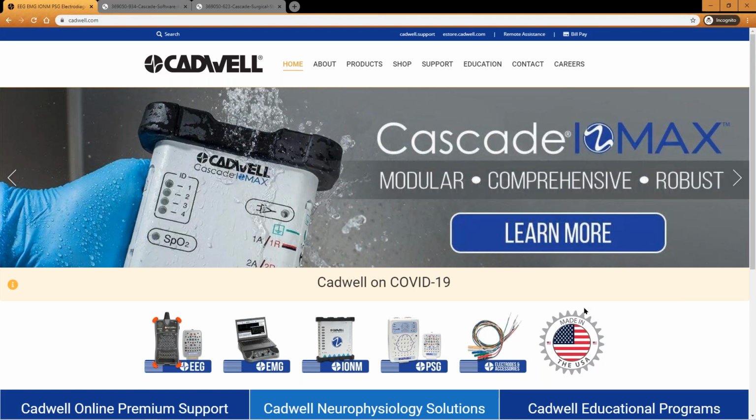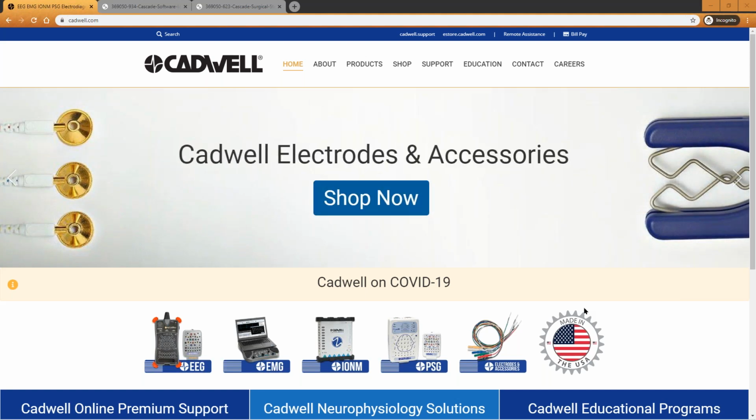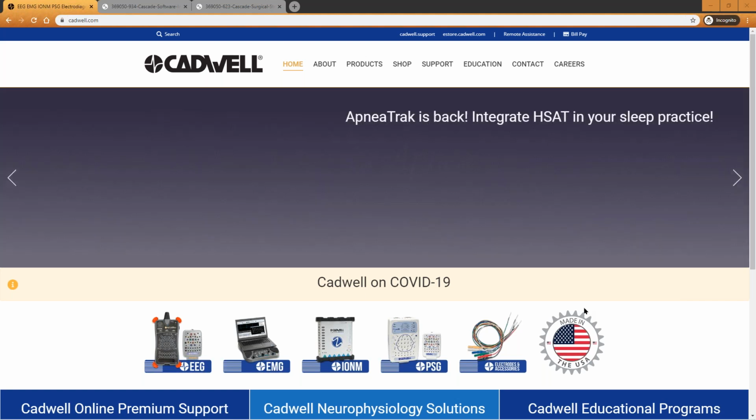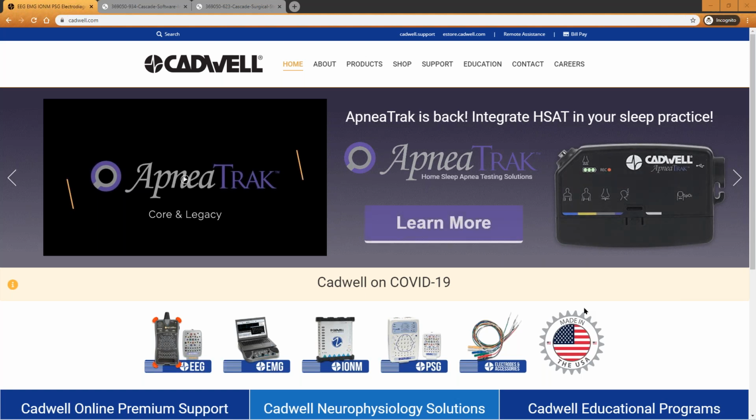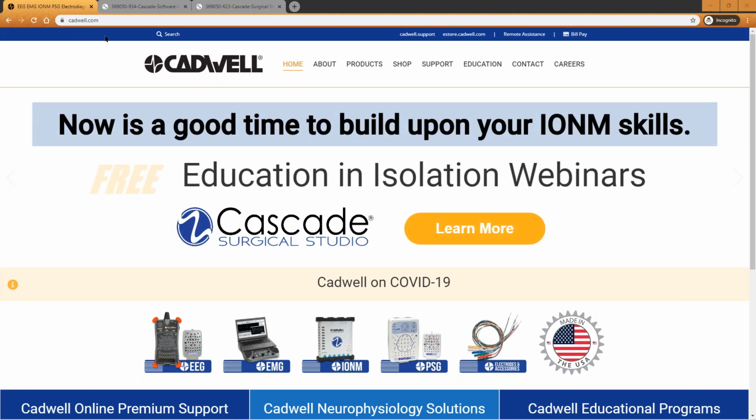Now, to get your hands on Cascade Surgical Studio, I know many of you probably have already gotten Cascade Surgical Studio. If you have a recent system that you've purchased from Cadwell, it will come pre-installed with Cascade Surgical Studio. But for those of you who don't, I do want to be sure you know how to get your hands on this piece of software. And that's what we'll do at this point. So, easiest way, go to cadwell.com. That'll bring you to Cadwell's website. And at the very top of that, choose Cadwell Support.